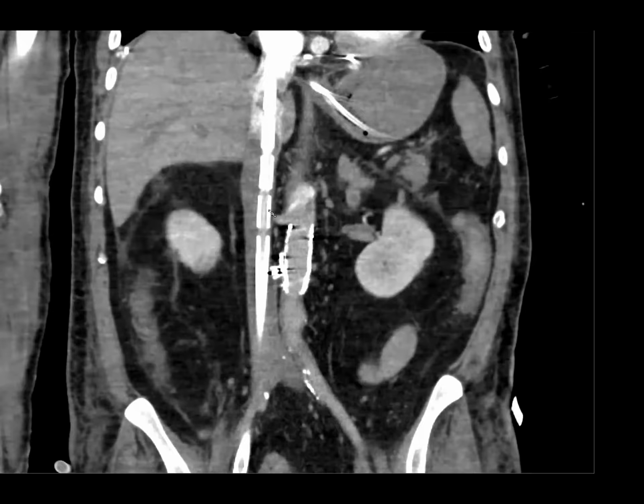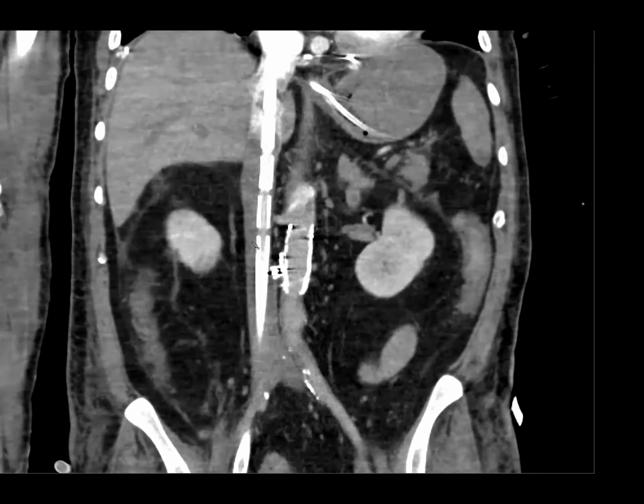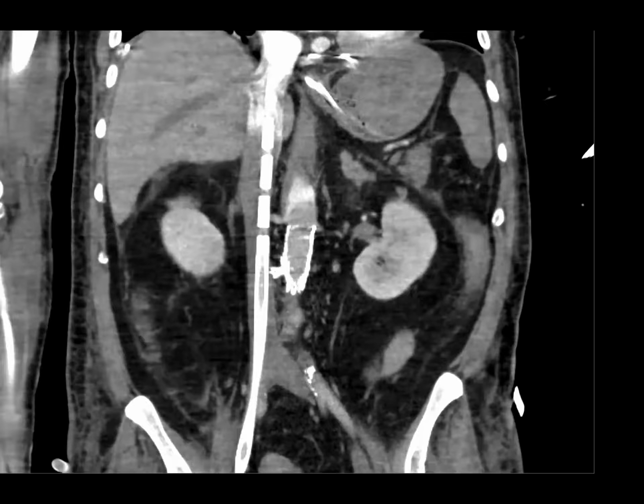Yep. So, and then this patient has ECMO, and that's one of the clues. They're on ECMO. You can see this large ECMO catheter here. Oh, like a mixing or something? Yeah, exactly. So, hold on one second. ECMOs play with your mind. What'd you say? ECMOs play with your mind? Yeah, the vascular stuff that you see in this is really confusing. Yeah, so that's why I thought this was a really interesting case.